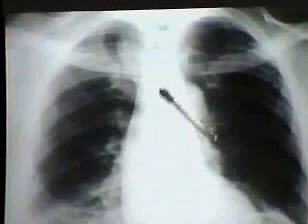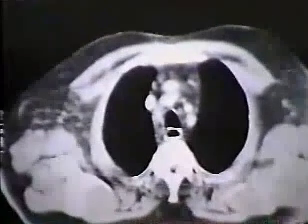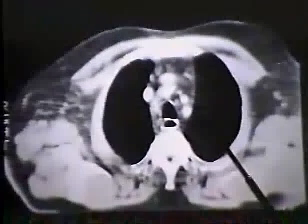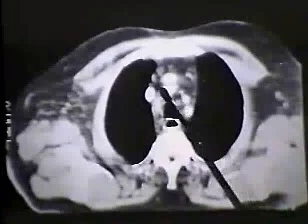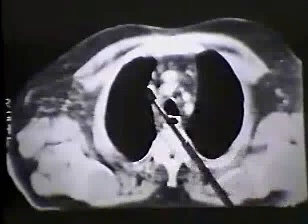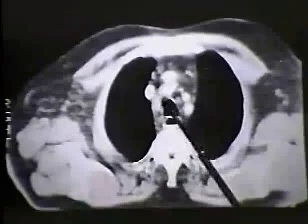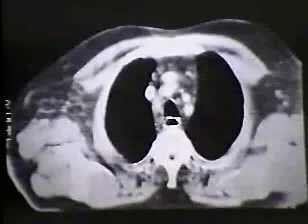Notice that in this particular case, you still have a tracheal wall shadow. That may not be present in many cases. Here's one more example of this. 2 different cuts from a CT scan of a patient with a tortuous brachiocephalic artery. We've got 1, 2, 3 arterial shadows, left brachiocephalic vein, right brachiocephalic vein, and a little indistinct partial volume effect. This would be the bottom of the loop of the brachiocephalic artery.